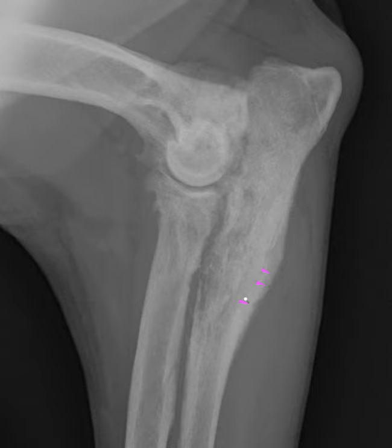As I finish B for bone, the next thing that I look at on a case is the joint, and the mnemonic for that is C for cartilage, but what we're actually talking about is the radiographic joint space. You'll recall that the radiographic joint space is that area of lucency between the subchondral bone, and the area looks lucent because it's composed of things which are of soft tissue opacity. So in the radiographic joint space here, we expect that there's going to be lucency related to the presence of the cartilage on the epiphysis of each of the adjacent bones, as well as synovial fluid, joint capsule, and any intra-articular soft tissue structures. Have a look at how this well-defined subchondral bone changes dramatically as we jump over here to what would be the trochlear notch of the ulna.